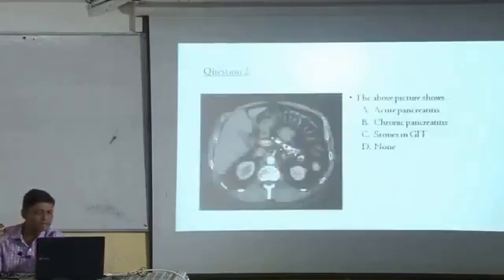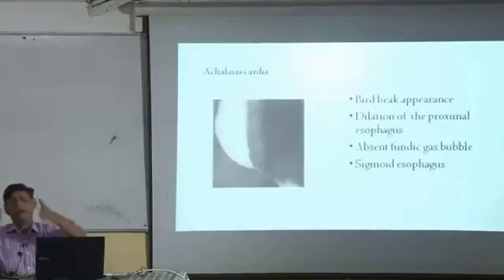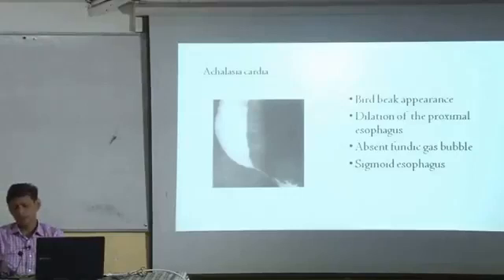If I have a dilated esophagus that is going down, filled with barium, okay? And now you tell me, scleroderma will mainly affect which part of the esophagus? The lower one third. Technically the lower two thirds, but mainly the lower one third. And what will happen to the lower esophageal sphincter in scleroderma? It will be dilated because the muscles are relaxed. This is why the esophagus has become dilated.